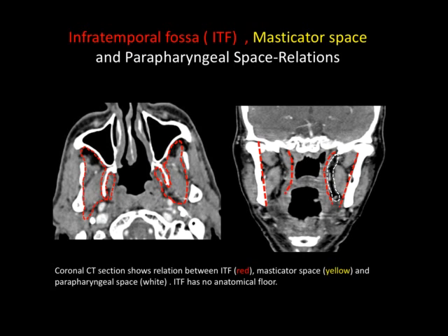Now, I started from the pharyngeal mucosal space, included the fat of the parapharyngeal space, included the medial and lateral pterygoid muscles, and reached up to the medial wall of the mandible, with some bit of the fat in the retromolar space also. This is the maxillary antrum, and this is the fat in the retromolar space. Whatever was in that area, we included and formed the infratemporal fossa.